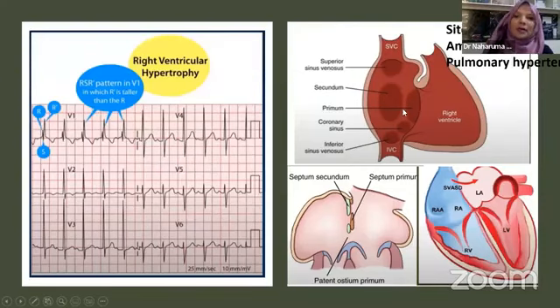What the ECG tells us: it not only diagnoses the ASD, but also tells some scenario of where the ASD is located. We know that there are types of ASD: secundum type, primum type, sinus venosus type.